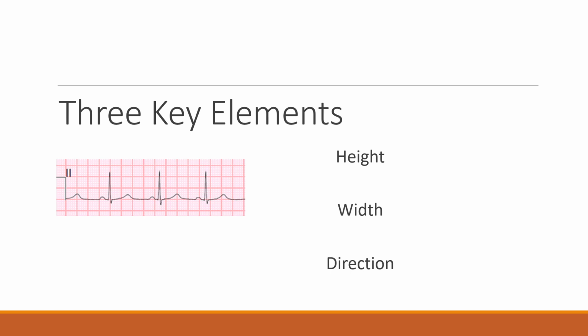But then also, you may have noticed that if you've done a 12 lead on a small child, you notice your QRS complexes are really big, even if the patient's not in distress, and that's counterintuitive. It should be smaller, right? The heart is smaller in the infant or toddler compared to an adult, so I would expect the waveforms to be smaller, but instead we often see the opposite. And why would that be?